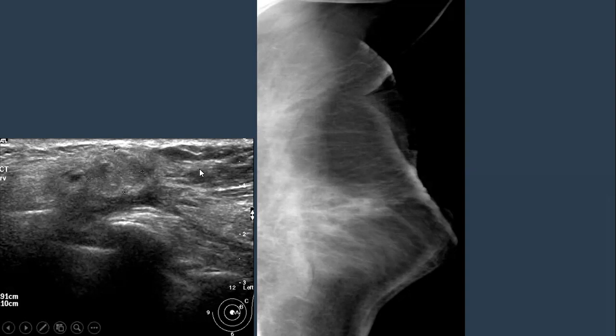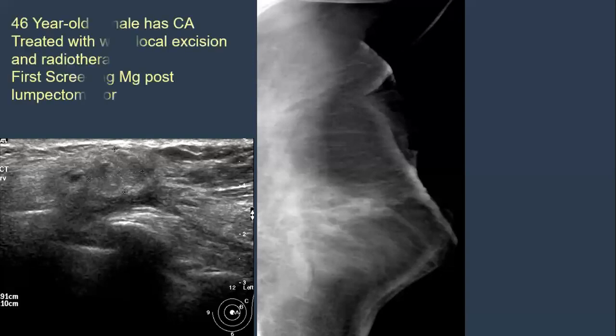what? With pathology. If margins are free, we are going to follow, and this is typical fat necrosis. We are just going to follow the patient. If there is anything suspicious or margins very close, then we can proceed to MRI to confirm or to do biopsy. But this is also a case of fat necrosis, very typical, okay?